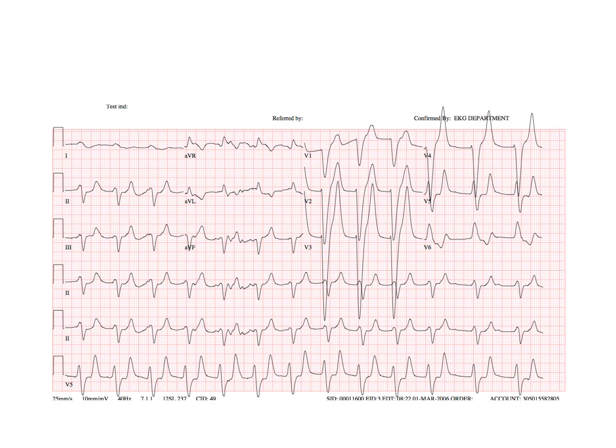Finally, we're left with hyperkalemia. This is an example of hyperkalemia. Now you will notice that it's actually not particularly slow, and most hyperkalemias are not at first slow, but they almost all end up being slow.